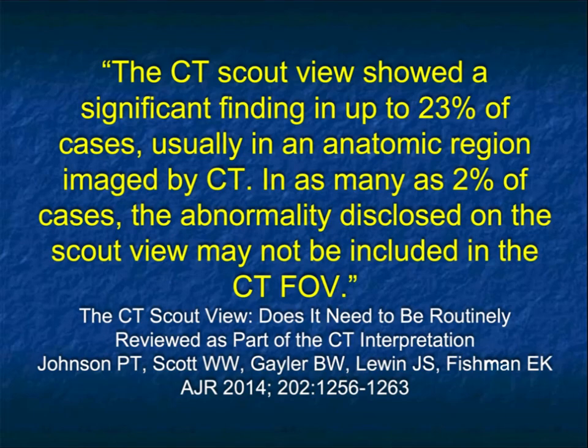Well, it's kind of obvious. Techs get a topogram. The topogram is made to localize the area you want to scan. We always try to scan only the area necessary because we can decrease dose. But if you did an abdominal CT, on the topogram the chest would be there in great part. You could see a lung mass.